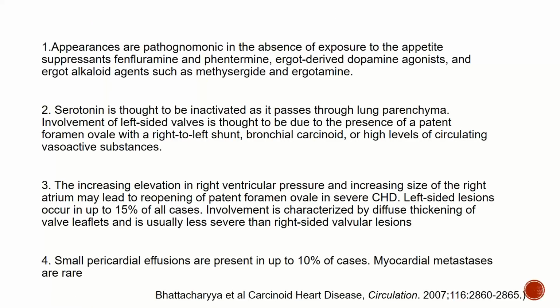A very important point is that the appearance of a thickened, retracted tricuspid valve is pathognomonic, but you have to rule out that the patient had exposure to some appetite suppressant, fenfluramine, or an ergot derivative dopamine agonist, which can give a similar feature. And the left side also can be involved in those kinds of patients.